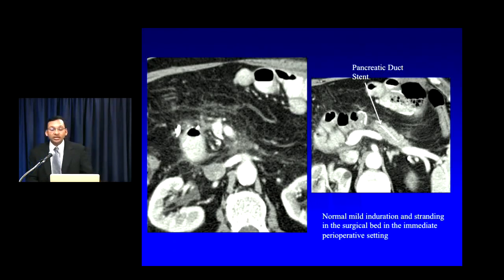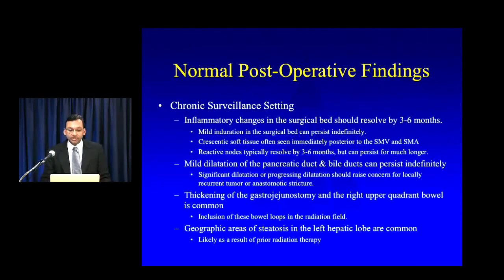The pancreatic duct stent in some cases can stay in the same place for months at a time, or in other patients can migrate relatively rapidly into the bowel. It doesn't really matter. I just report where it is in my dictation.